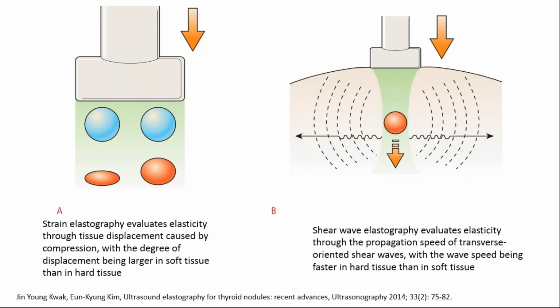So the most important application at present in musculoskeletal imaging is in tendon imaging. So with elastography, if you combine our B mode imaging, which we all do, which is brightness mode imaging, with tendinosis or tendinopathy or other tendon diseases, what we see is a hypoechoic tendon, which is enlarged.